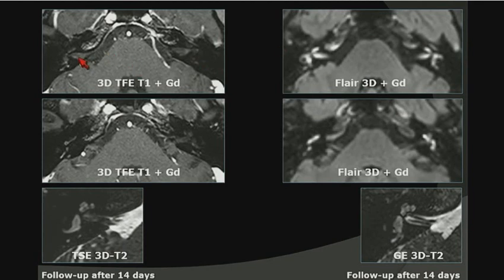This is the same patient the same day, with infection, sudden deafness on both sides. And you see on the right side, I have some enhancement in the basal turn, but look on my FLAIR. And on the other side, I have almost no enhancement. I would make that normal. And look on my FLAIR. Everything is enhancing. So much more sensitive. So detection of infection today, that is FLAIR.